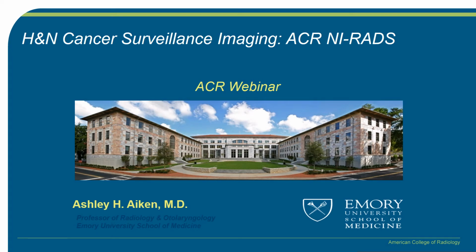This webinar will cover the difficult topic of imaging the post-treatment neck, with particular attention to structured reporting with NI-RADS, but also the timing of surveillance and how to categorize imaging findings from expected post-treatment changes, to focal radiation changes that may mimic tumor recurrence, to findings suspicious for tumor recurrence. NI-RADS can make these cases simpler to interpret, saving you time, adding confidence and clarity to your read, saving your referring clinician's time and energy in deciphering your level of suspicion, and finally, adding value for your patients.